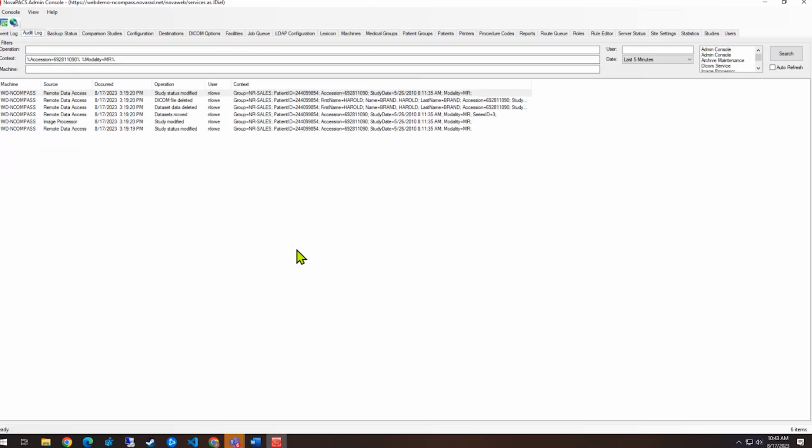The audit log is very similar. It gives kind of the same filters and information, and you have the same filter options over here. The difference is this is going to be a lot more about changes to patients and things like that, when things were ordered. It's going to give a lot less about how everything's functioning and what was done.